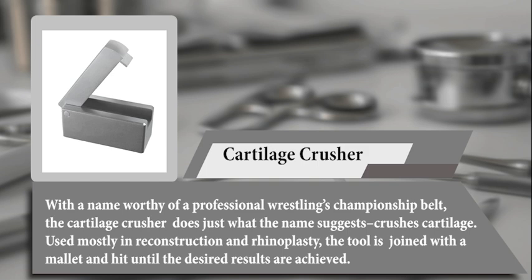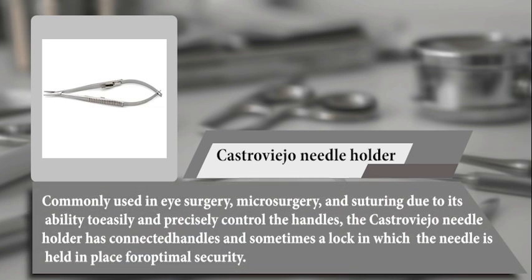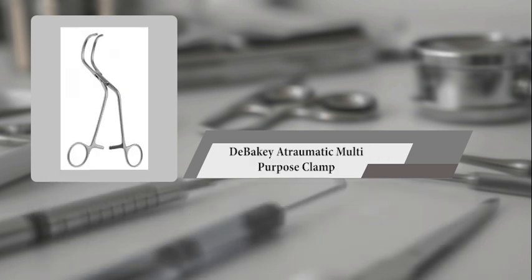desired results are achieved. Castroviejo needle holder. Commonly used in eye surgery, microsurgery, and suturing due to its ability to easily and precisely control the handles. The Castroviejo needle holder has connected handles and sometimes a lock in which the needle is held in place for optimal security.